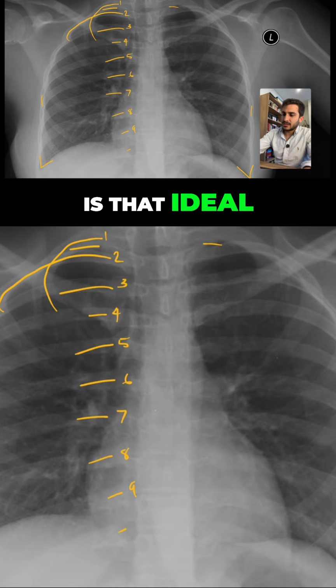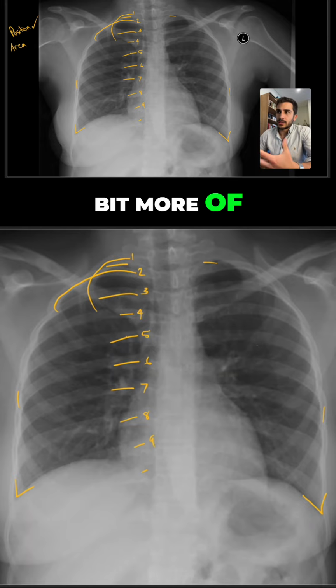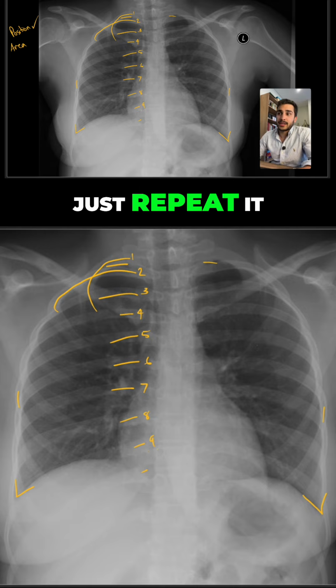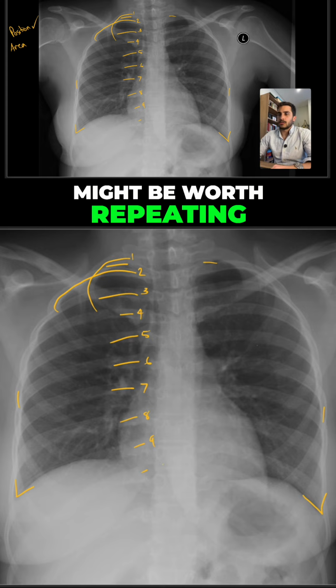Again, is that ideal? Not really. Just looking at the chest x-ray itself, you can tell that they could have made a little bit more of a better effort in their breathing in. So in this particular case, I wouldn't necessarily just repeat it. I would ask the patient, hey, is that the best effort that you could do? If we were to repeat this, do you think you could do a better inspiration? And if they can, it might be worth repeating, although it's borderline.